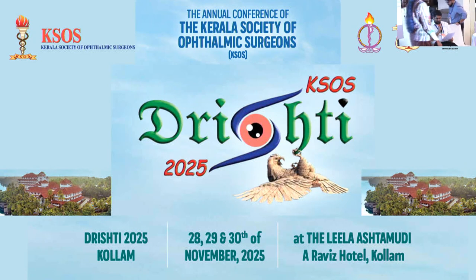The excellent presentation, and now we can diagnose whether the disease is glaucomatous or non-glaucomatous. There are many tips in the OCT. If you go through it, if you specifically look at the signs, we can very clearly differentiate. Now there are no glaucoma suspects. Now there are no disc suspects. Now we can just directly diagnose in most of the cases using the OCT if you interpret it properly.